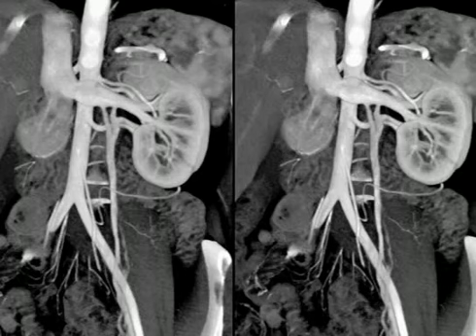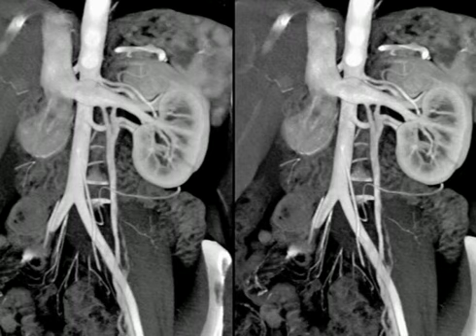In terms of being able to detect vessels, yes, you can scroll through the data sets, and I would agree that if you were very careful and looked at every single slice, you would be able to pick up all the renal arteries that were present, but it would take you a whole lot longer than looking at it in 3D mapping. A 3D map makes it very easy to recognize the number of renal arteries.